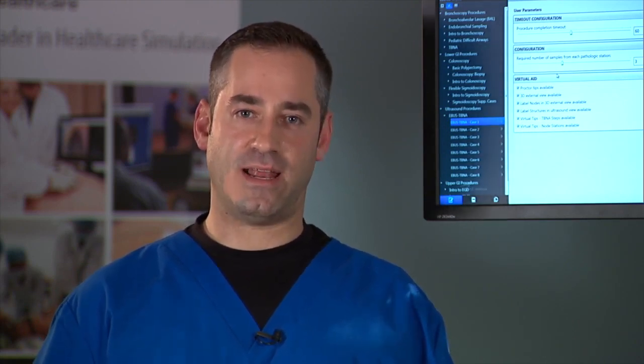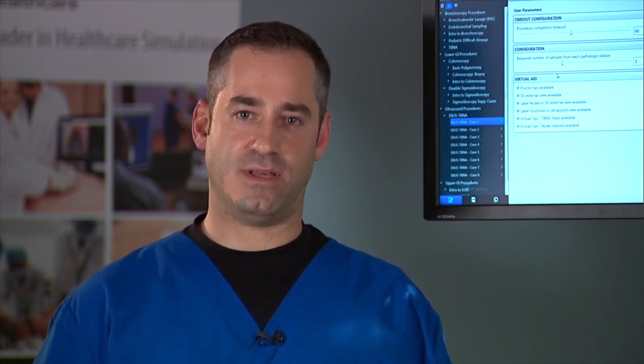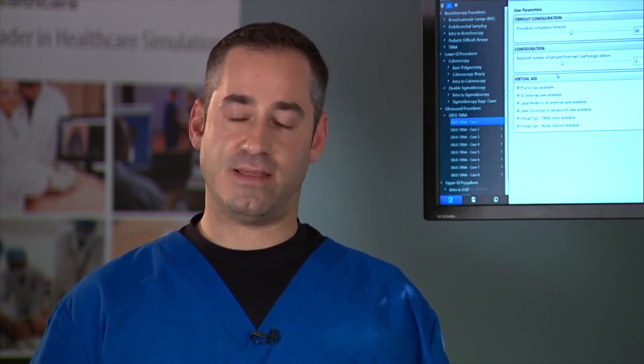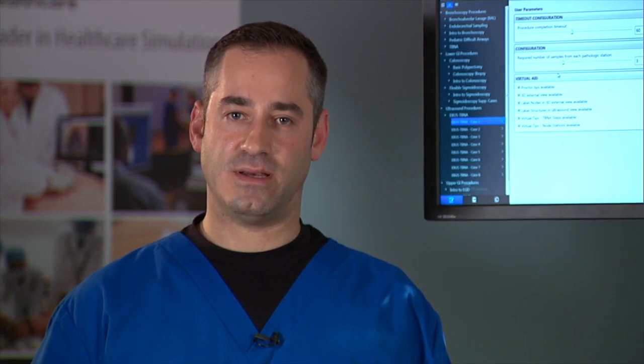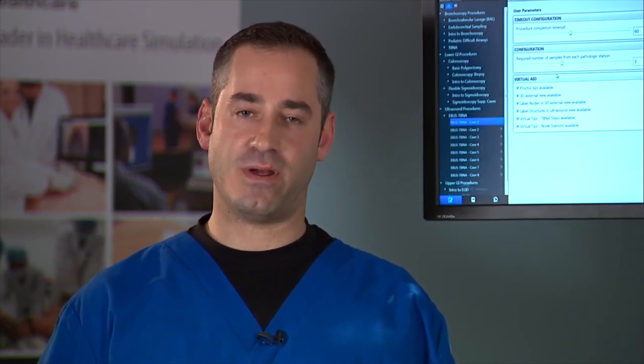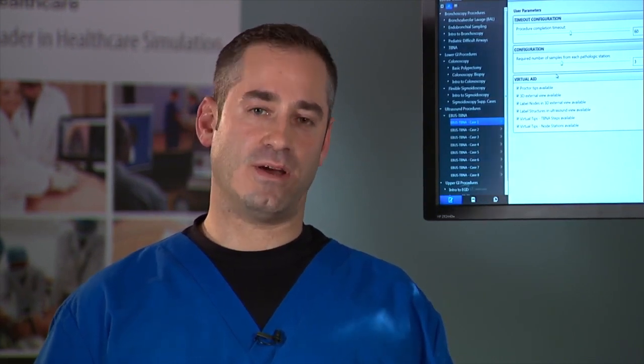In the real clinical setting, they can raise the patient bed up or down, and we've replicated that within the simulation. Second, highlight the fact that they can export student data. This is key within research environments. Most doctors within university settings have the desire to publish. It helps them further their career. So promoting the fact that they can export data can be very beneficial to them when looking at new research topics.